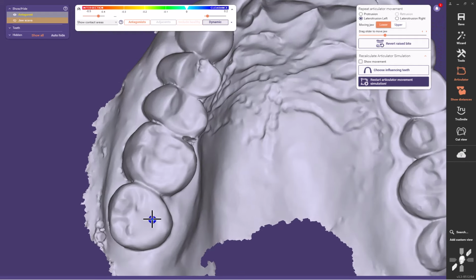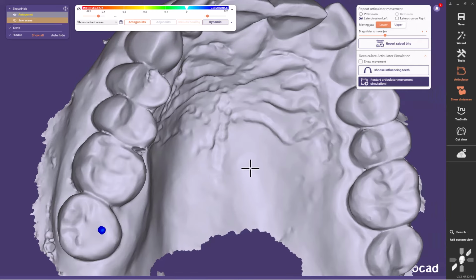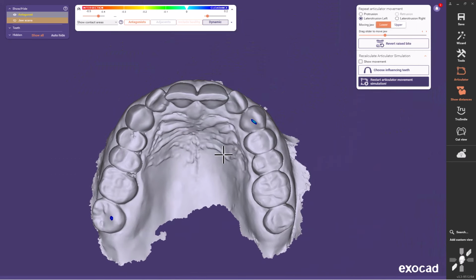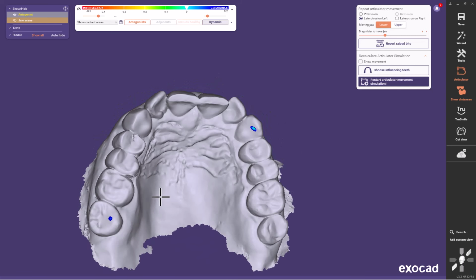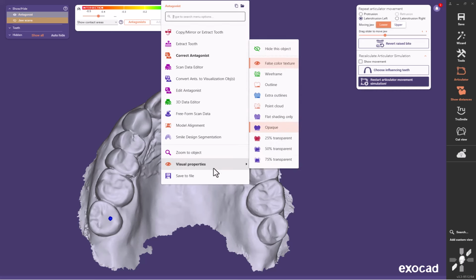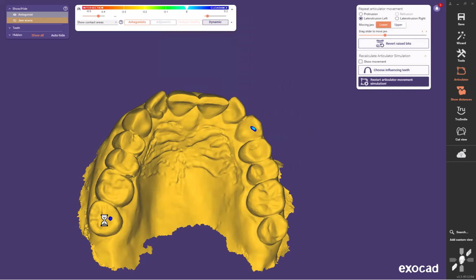Remember, it's only the light blue that's contact. Dark blue is actually a separation, so it's guiding right here, very definitely. And I would probably choose not to steepen the guidance any further, so I'll just remove a little bit back here.